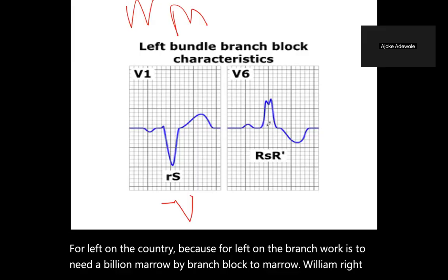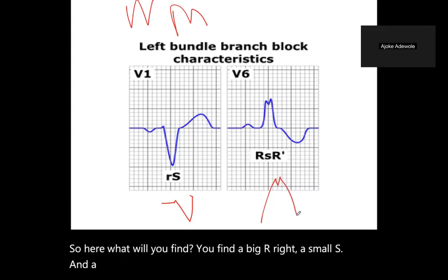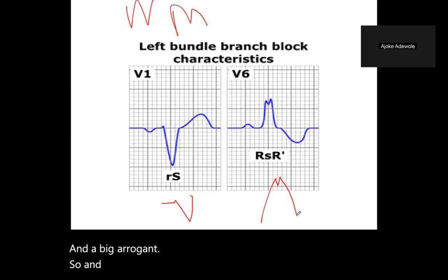So here, what will you find? You find a big R, right? A small S and a big R again. So, and that's it. That's what you will find in your V6.